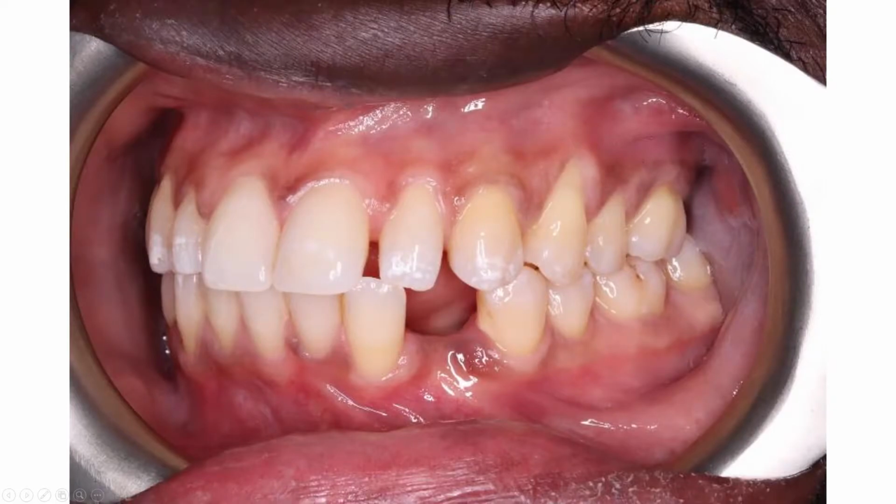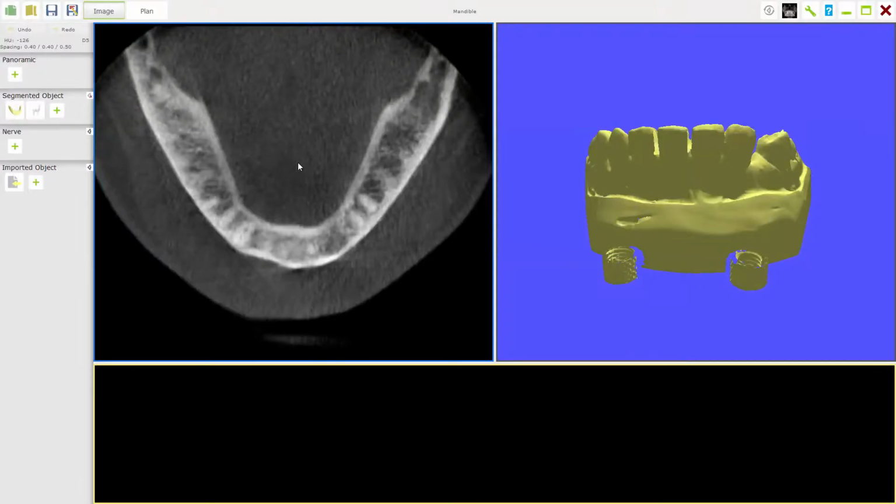Here we can see the space more clearly, and it is quite large mesiodistally to accommodate a normal type of crown. And even the upper canine looks slightly smaller. The other thing to notice about this occlusion is that it is a class 3 occlusion, so our canine, when we eventually replace it, will be occluding partly against the lateral incisor, which is not the case in a class 1 occlusion.